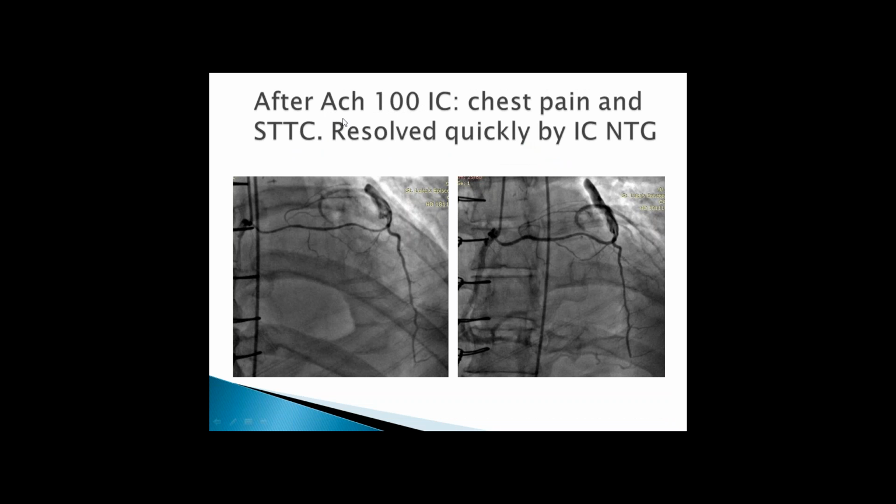So this was the finding during an angiogram. They showed that the bypass, the vein graft to the proximal left anterior descending, was perfectly functional, and the proximal left main had diffuse spasm at rest that with nitroglycerin improved a little bit, but essentially most of the flow was coming from the vein graft, and the distal left anterior descending was much better than before surgery, but obviously still there was a possibility of spasm at the level of the proximal left main.